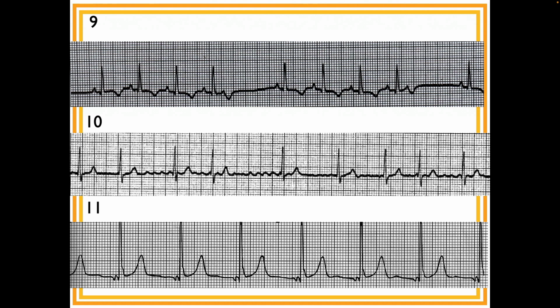Brilliant. Whoa, whoa. Okay, you need to point out the non-conducted PACs. A P wave right here. Okay, go ahead. There, there, and then there, and then there. Yep. So let's go through this.